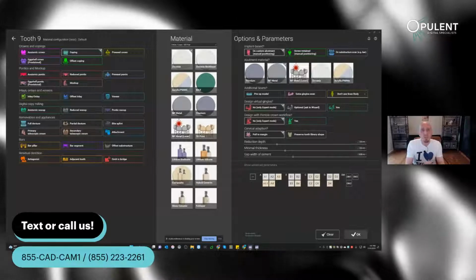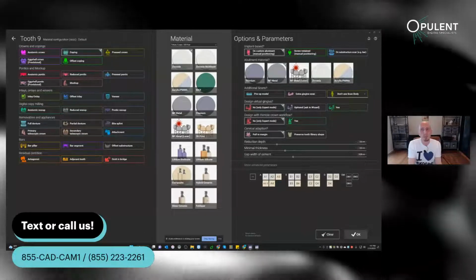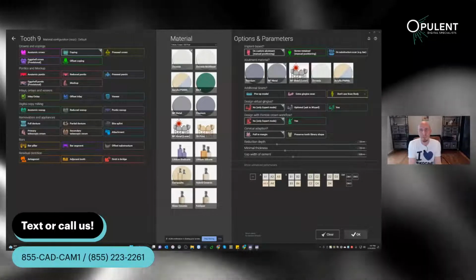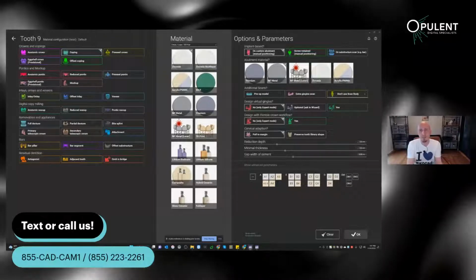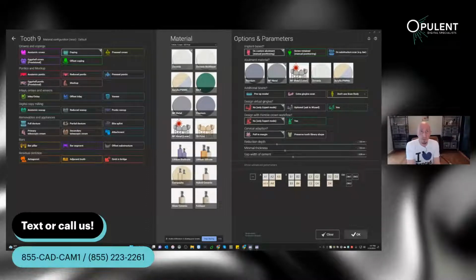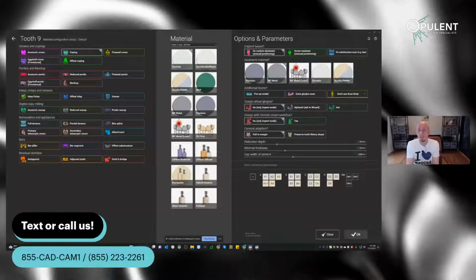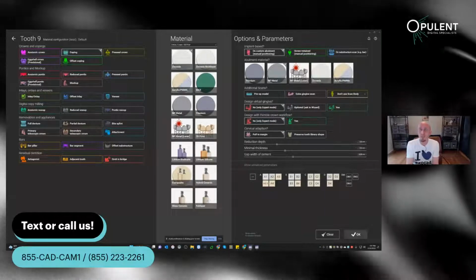And then, worst case scenario, you can treat the part which now came in the mail, where you can't figure out what your library is for. You can scan it with, yes, you have to spray it, and yes, it's not as accurate as if it was done with a scan body, but you get the case done, and you can actually still customize the part.